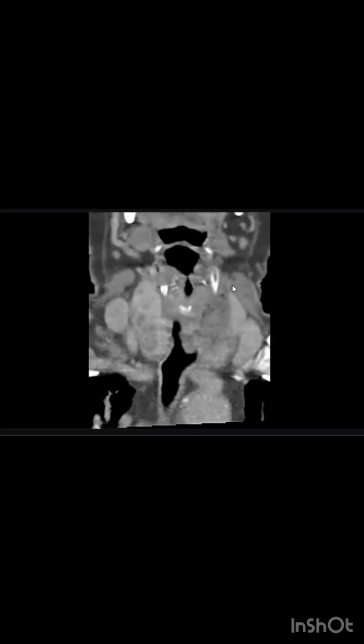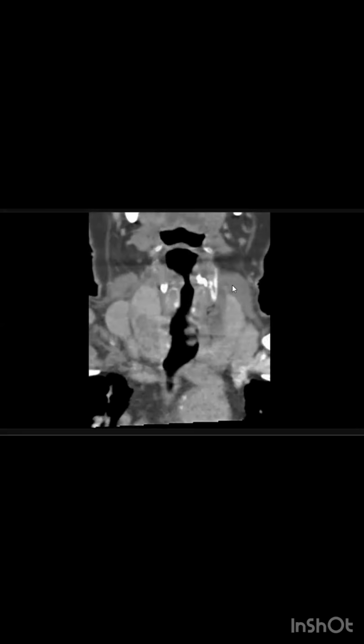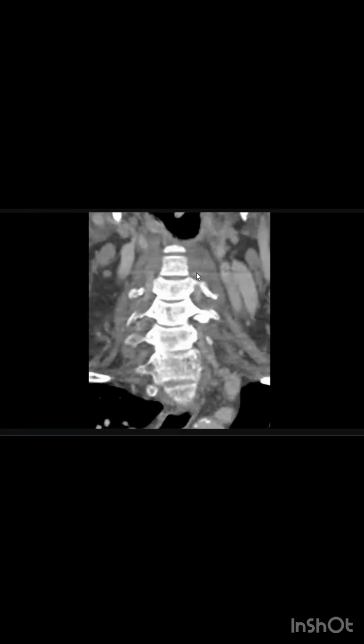Unfortunately, no sagittal images, only coronal. Yeah, these are coronal images. On the coronal images, the similar findings are reproduced, and this mottled density appears to be oriented more anteriorly, as I am not able to see the bulk of it on the posterior aspect as I am coming to the vertebral bodies. So the top differential in this case would be Killian-Jamieson diverticulum, which is oriented rather more anteriorly.